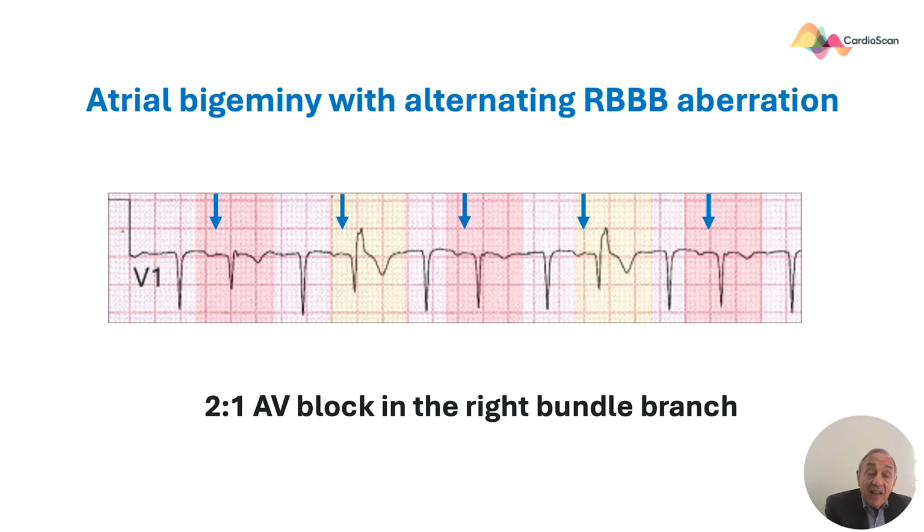And you can see that the atrial ectopics there either conduct normally or with an aberrant ventricular conduction. There will be people in the audience that will question this one and say that this may be a rate-dependent right bundle branch block and therefore is pathological. Here is atrial trigeminy with aberrant ventricular conduction. And again, look at the V6 and you'll see the narrow QRS.